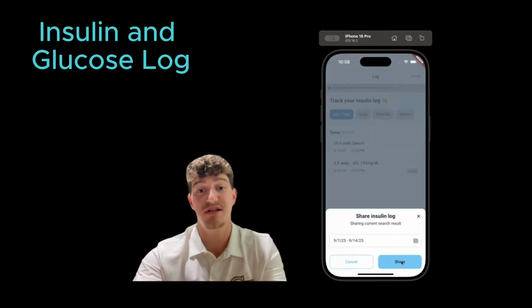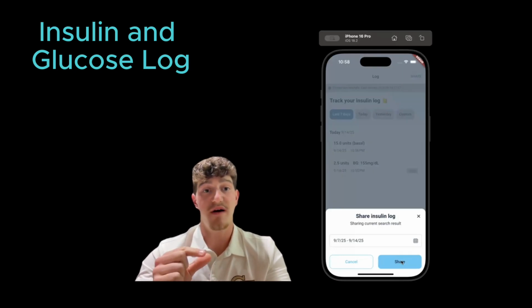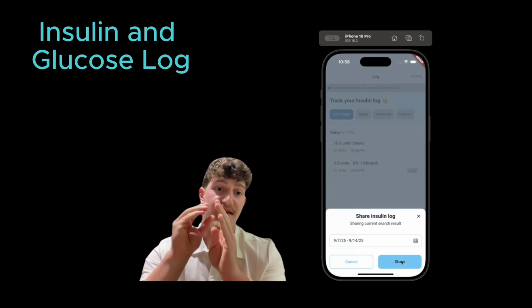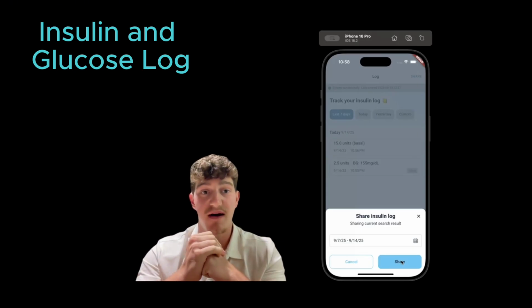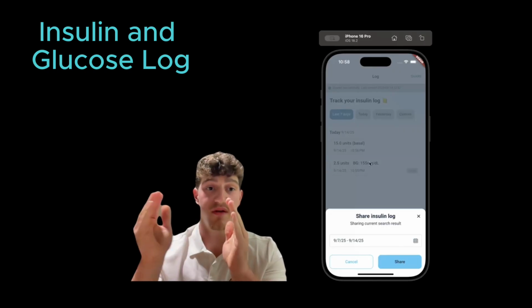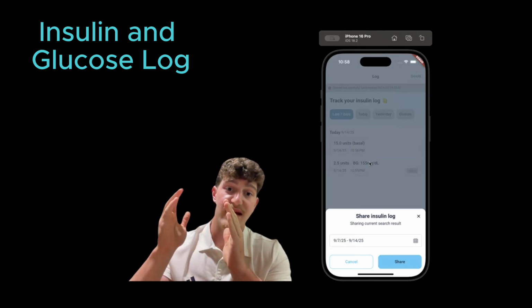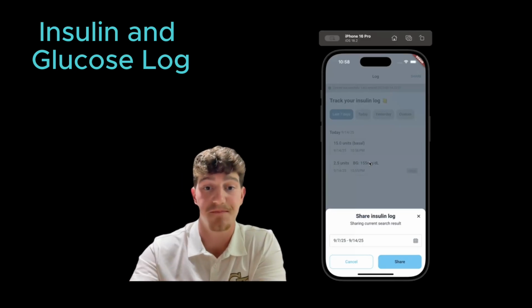And then when you click this share button, it will actually create two files for you. One file will be a summary by day. It'll show you different times throughout the day and the data of the logs that you made for each day. And then the other file will just show you every single log you have, very similar to this insulin log, but it will show you all the data that you see when you click inside of one. So it will say the insulin you take, any notes, everything, all in one big list in a CSV file.